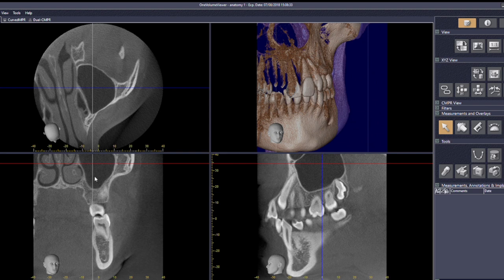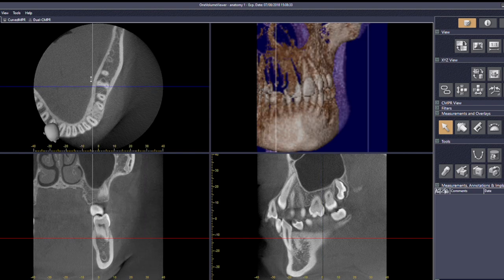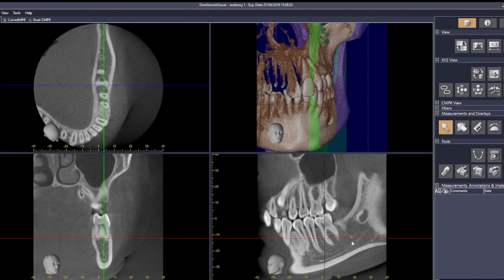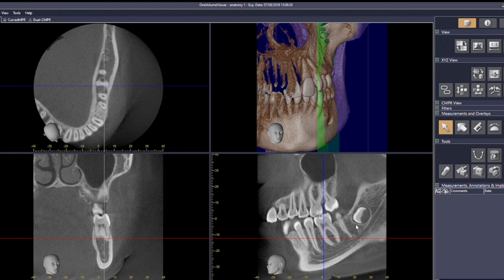Okay, we did the antral outlines, really important things to check. The other thing in the mandible I asked you to check was the mandibular canal. So let's start up with the mandible, and now we can start to see the ID canal. And as I rotate, you'll have a nicer view. Look at the ID canal looking really nice there, up to the mental foramen and all the way to the back. We can also see the lacy trabecular pattern holding the teeth in, and we see a relative sparsity inferior to it. Here's the ID canal in coronal section.